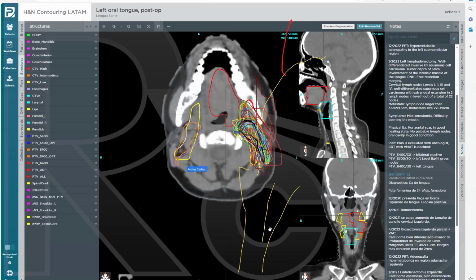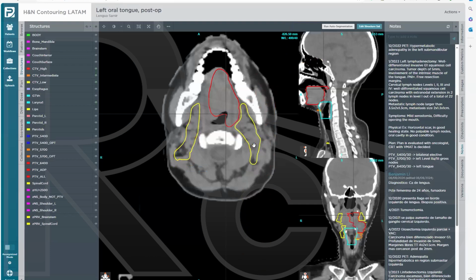Oh, I think someone was having fun, or someone went out last night. Yes, I think so. Okay, so let's see again. You're drawing the blood vessels right here. Dr. Patel is already drawing. Right. So just illustrating that.